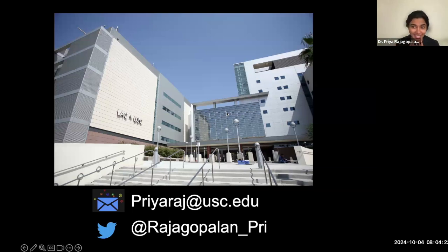In a spotter case, it's going to be challenging. But the way we thought about it was this patient luckily had a scan done before that did not have this lesion. And then suddenly, within a year, had this really large lesion with so many fluid levels that, obviously, it pushed us towards something that grew very fast, and it's going to be a metastasis. So it was a renal cell carcinoma.